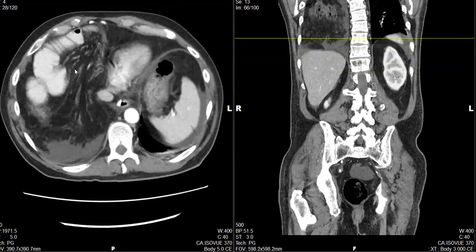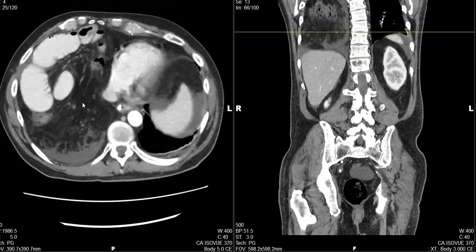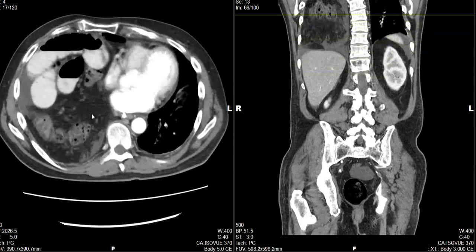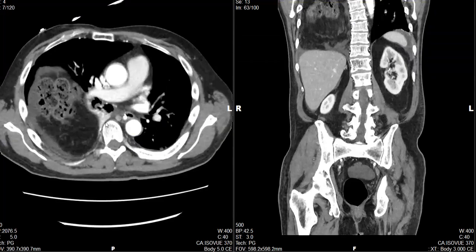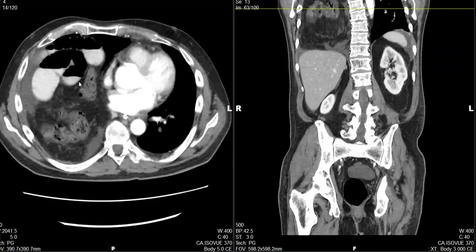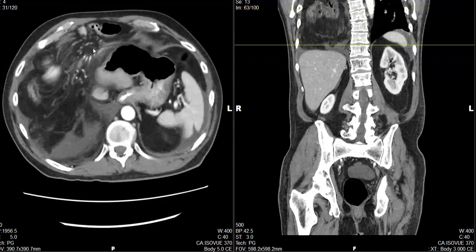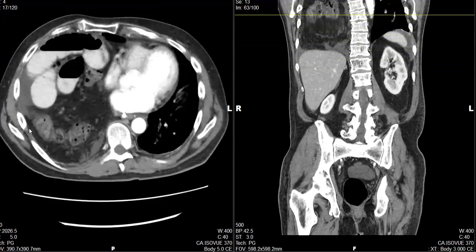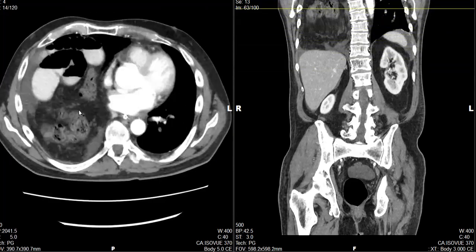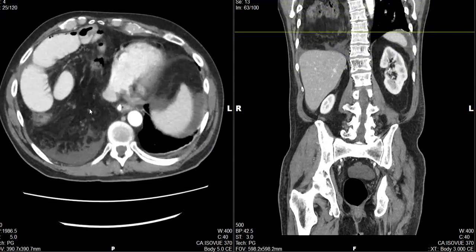That also is secondary to the local mass effect and constriction at the hernia site that has led to the mesenteric edema here. There is some reactive edema all around. So these findings are consistent with foramen of Morgagni hernia containing obstructed loops of small bowel causing closed loop obstruction. Additionally, we see these large bowel loops, and they are not dilated and they do not demonstrate any evidence of obstruction.